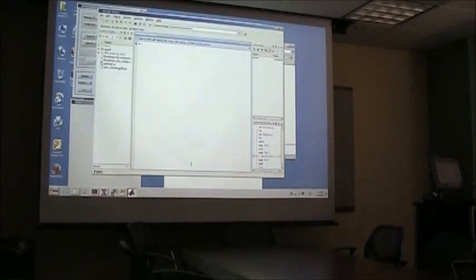This is a different way to save the data, a 4D way. Here not each volume is a separate file, but basically all the volumes of one run are combined into one. So this is a 4-dimensional file. Okay, so then I could put this in SPM and model the times of the events?